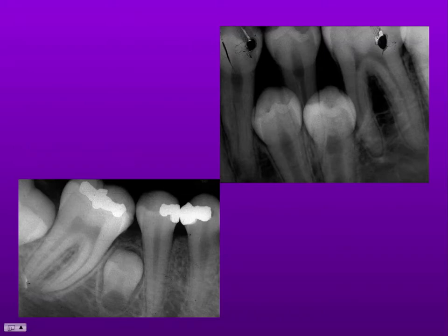We can refer to extra teeth, hyperdontia, as supernumerary teeth. It's a term that's very commonly used and is perfectly acceptable. However, we also have another term which just confuses things, and this is called supplemental teeth. Supplemental teeth are supernumerary teeth which resemble in every respect a normal tooth. Think back to the mesiodens, which was a very rudimentary small tooth.